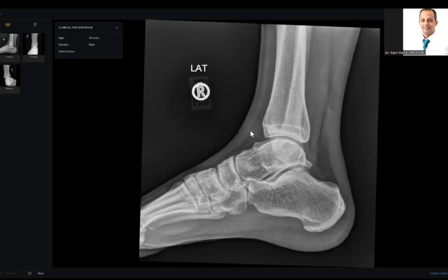I'm now looking at the soft tissues. I think likely there is some interrupted Achilles tendon in this distal part, which might be concerning secondary to the trauma. And so I will discuss the findings immediately with the referring physician and ask for MRI of the patient to further evaluate this and rule out any other associated injury.